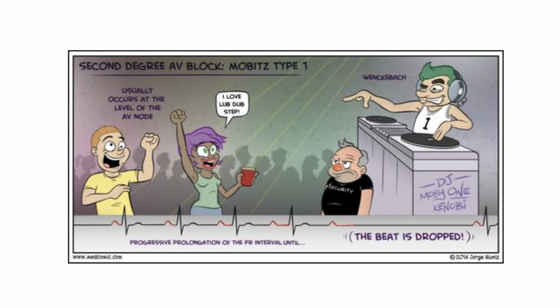Did you know Wenckebach was a DJ? Why? Because he dropped the beat. Thank you to MedComic.com for this. So you get progressive prolongation of the PR interval, and then suddenly you have a drop beat, right?